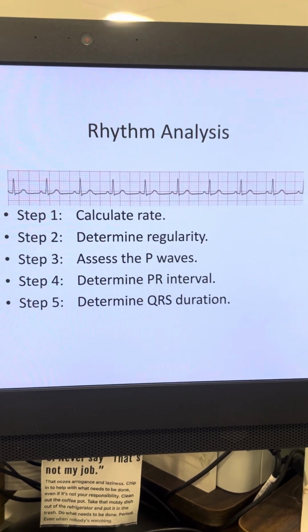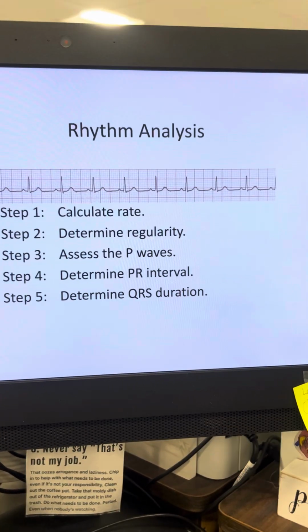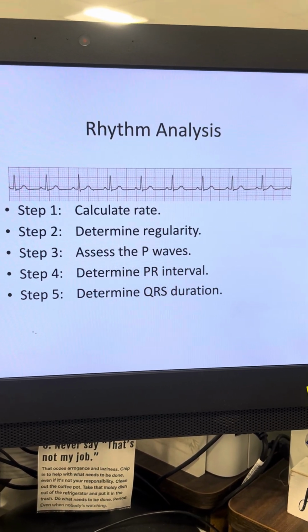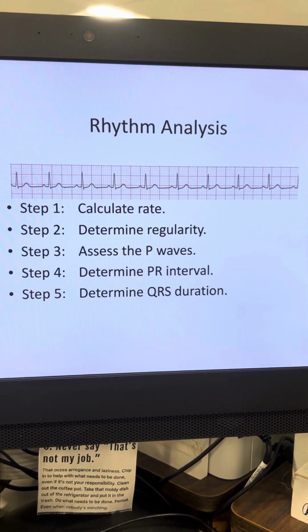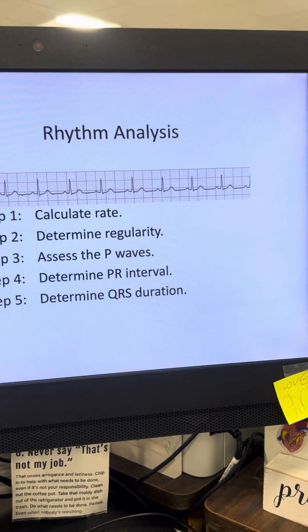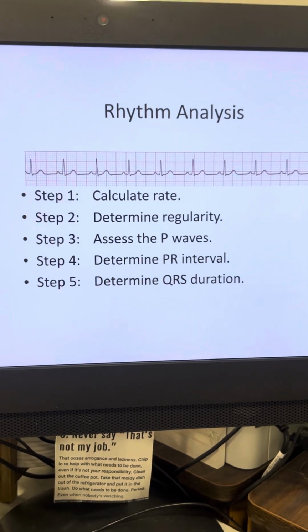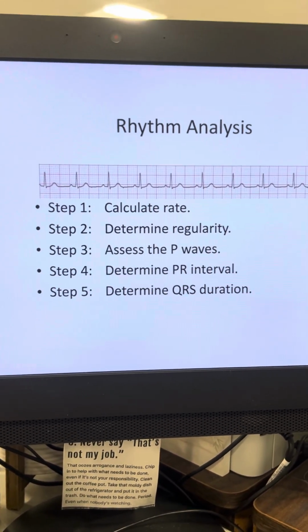Okay, so this is the normal sinus rhythm. So when you see this, if you would do it very fast, I would look at this, and if I knew it was a 30-box strip, I would say 1, 2, 3, 4, 5, 6, 7, 8, that's 80. I'd look at my P waves, yes, check, check, check, check, check. And then I'm going to look at my QRSs, I'm going to look at my T waves and my line of repolarization, which is, if you can see me pointing right there between the T wave and P waves, that's all regular. I would say, okay, normal sinus rhythm. That's how fast you're going to be able to do it, and that's what we're training to be able to do.